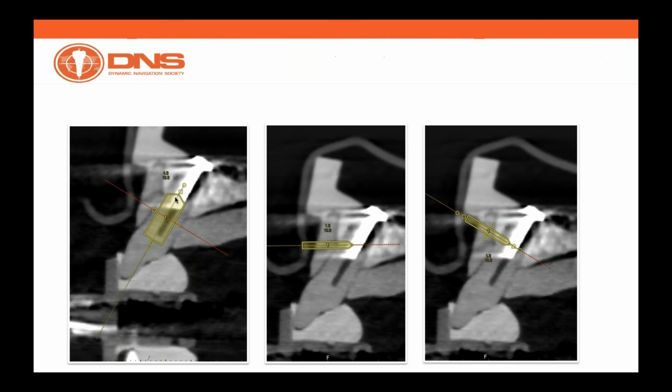But as we said, we opened up Navident to another host of potential users, such as, for example, endodontists who might be interested in apicoectomies and might be interested in angulating the planning of these apicoectomies under angulations which are not the standard angulations of an implant.